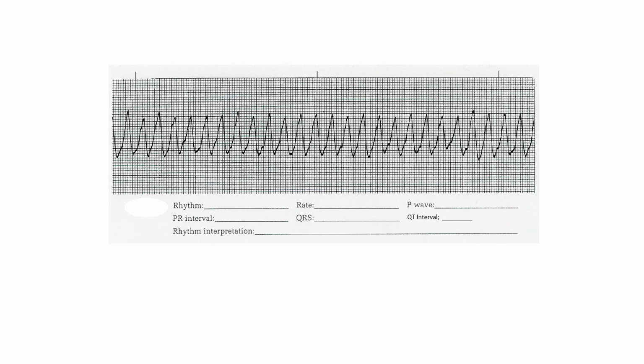The sync button comes up, and what you're going to see are marks on your R waves. It's going to identify where your R waves are, whether it's a dot or an arrow, and mark all of the R waves across the strip. You get the idea. It would mark all of the R waves, and it would say sync.